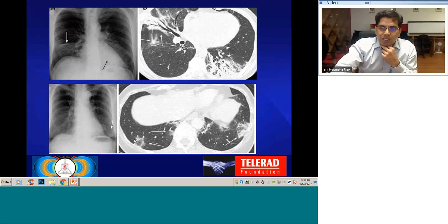And you can see in this bottom image these pneumonitis patches, which have a characteristic pattern of reverse halo sign. Here, the central ground glass is surrounded by consolidation. That's a reverse halo, which is commonly seen in this cryptogenic organizing pneumonia. So you need to be aware of these non-infectious pneumonias as well.